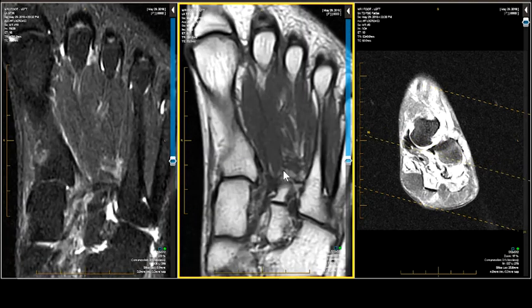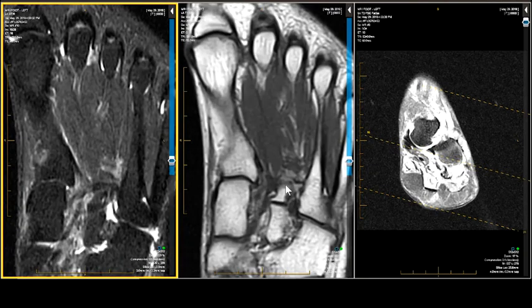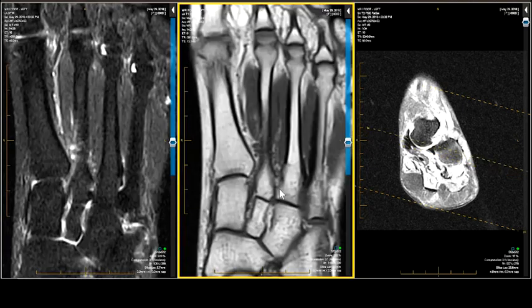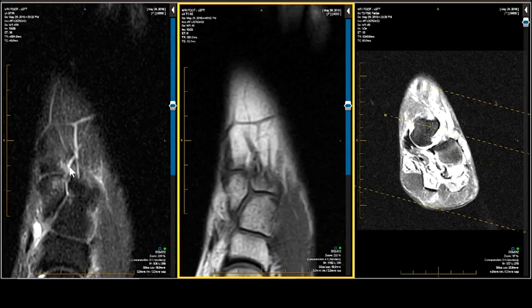Let's go down and check the plantar ligaments. Well, that's a ligament. That's a ligament. That ligament should look like that ligament. Plantar ligaments are not normal in this patient. They're swollen. So this is not an inconsequential injury. There's a dorsal ligament. That one's present on the left.